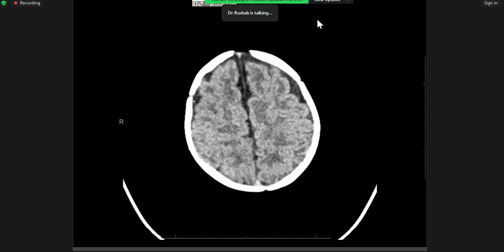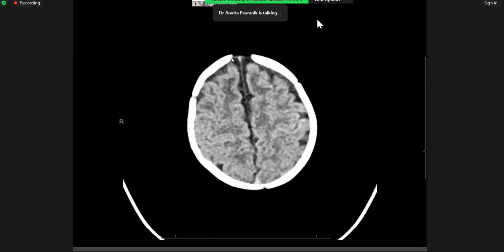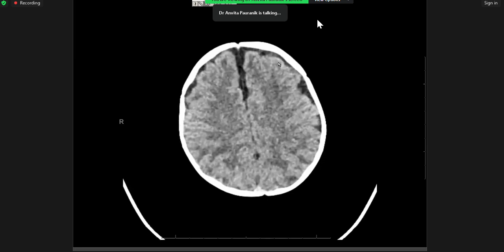No, ma'am. The frontal lobe gyri look normal to me. Yeah, so again, it can be a bit overcalling, right? On CT, it can be just too much. So we are not assessing for cortical malformations unless it is very obvious lissencephaly or diffuse polymicrogyria. It will be very hard. So this is totally fine.